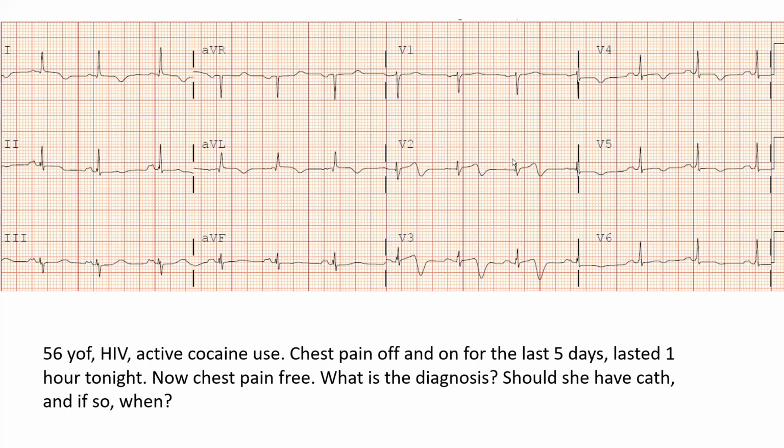It's a specific T morphology where you have a straight, as you see here, straight or convex ST segment that suddenly takes a sharp turn down into a T wave. The sharp turn should be almost 90 degrees into a T wave. So it's not a shallow curve into a mildly inverted T. It's a deep turn into an inverted T wave. It might be biphasic, as it looks here in V2, or it might be just deeply inverted T. And in most cases, you have a deeply inverted T, not biphasic. 75% of the cases are deeply inverted, 25% are biphasic.